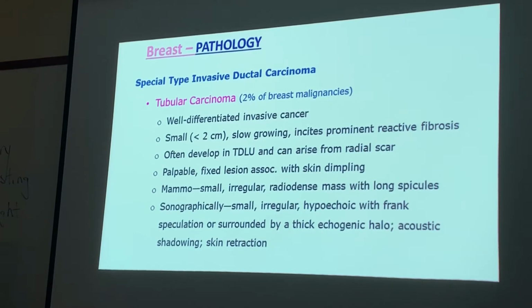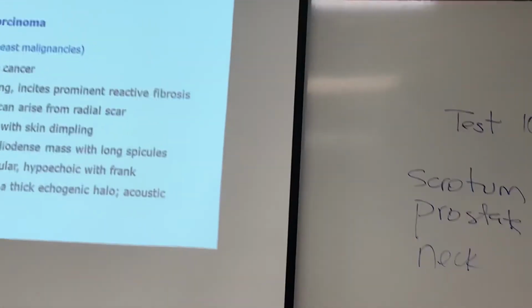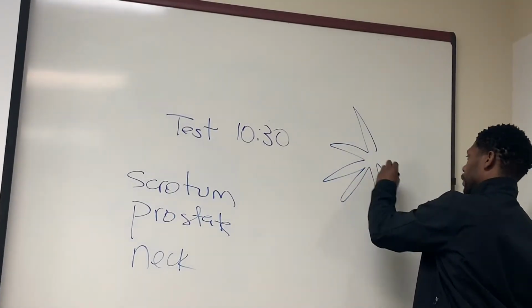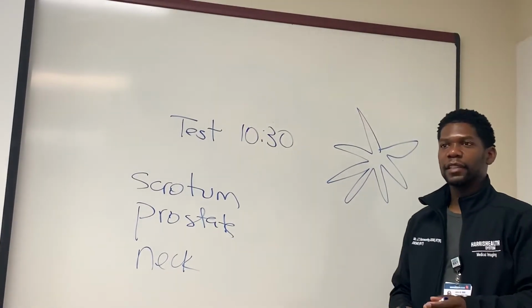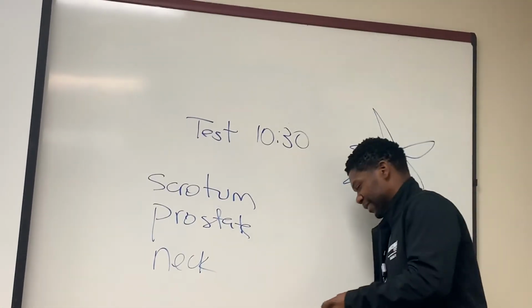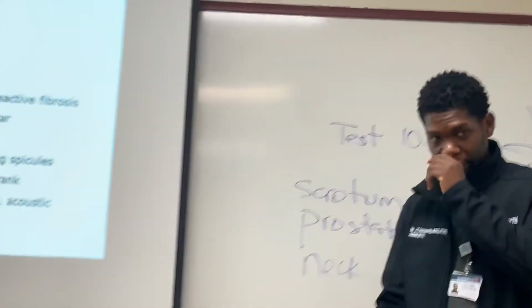Spicules are, I don't know if you remember seeing that image earlier, it looked like it had those points coming out of it. You know what I'm talking about for the image earlier? No? I'll show you in 1 second. When they're talking about spiculation or spicules, it kind of has like a. Those are spicules. They kind of spread out. Spikes. Yeah, spikes. I like that.